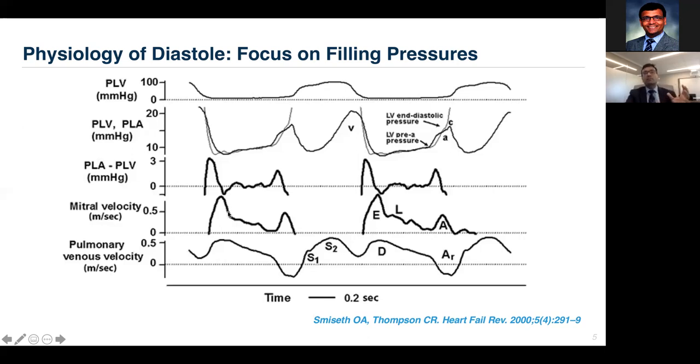So under these forces, the deceleration of the momentum of the flowing blood is happening. And this gives rise to a slight difference between the peaking of the E wave and when the blood flow starts decelerating. Notice that the peak of the velocity is happening just after the peak of the gradient, and is only decelerated when the gradient reaches zero and lower.